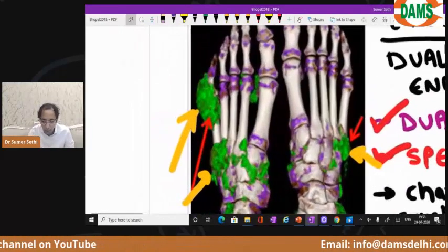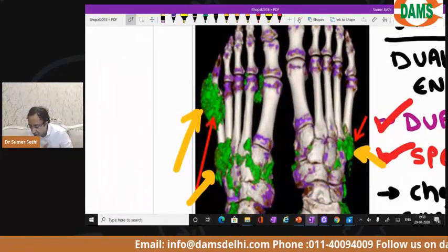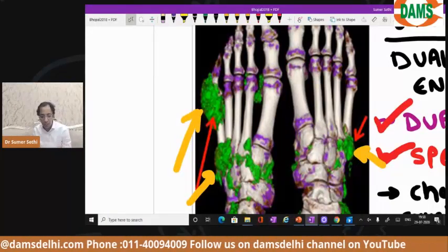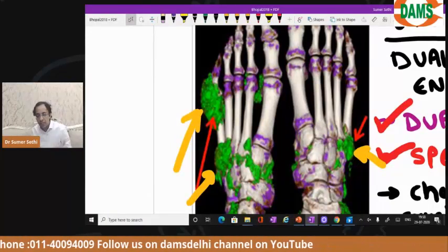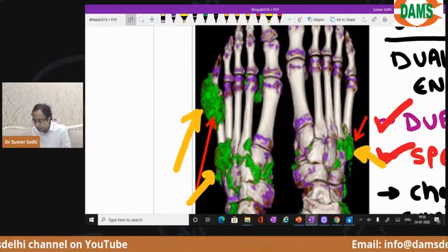Okay, and those purple things are the calcium phosphate in the bone. What is purple here, beta, is the calcium phosphate in the bone, and the green thing is the uric acid. We are able to characterize that using a dual energy X-ray map that is available in the CT algorithm, and we are able to do this.